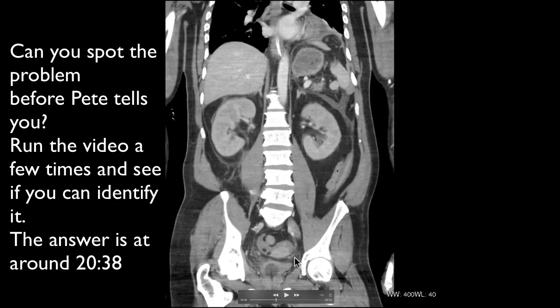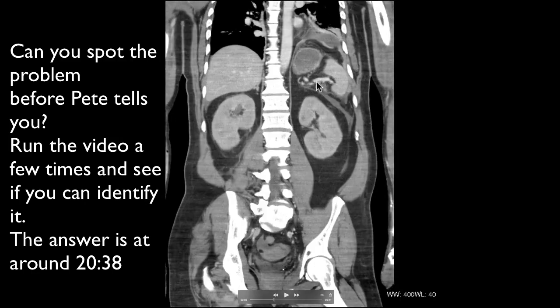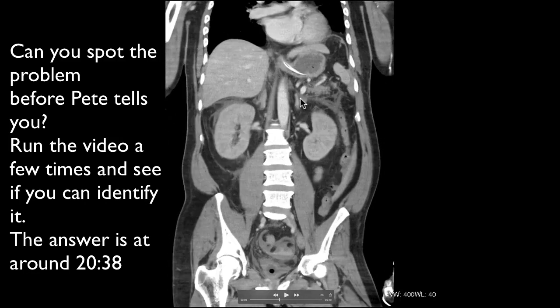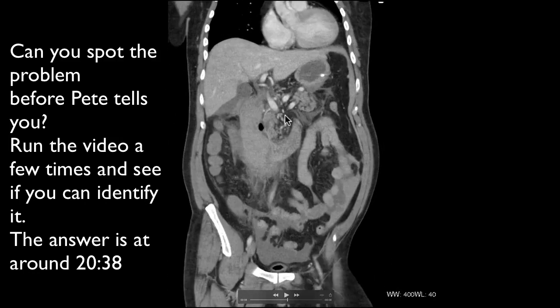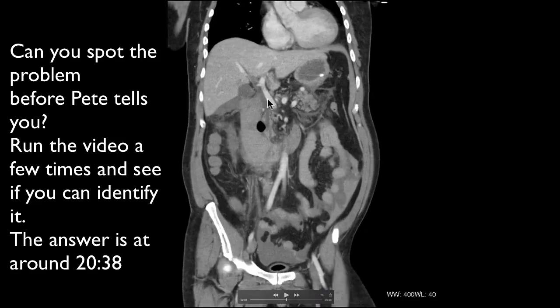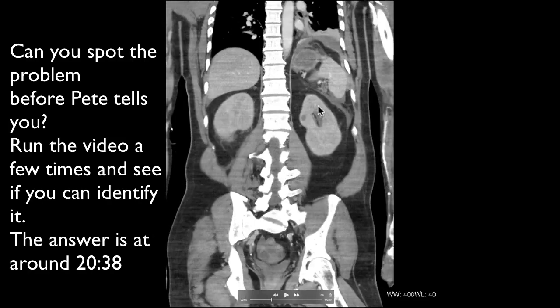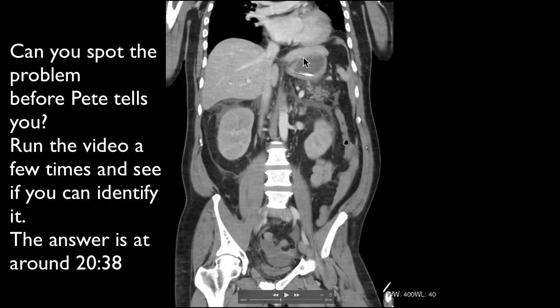So in this patient it's quite nice because you can see the splenic vein really clearly, especially on these coronal images. That's the splenic vein going out towards the splenic hilum there. And you can see it coming over to the midline here where it joins with the superior mesenteric vein to make the portal vein going up there. Those are the kidneys there.